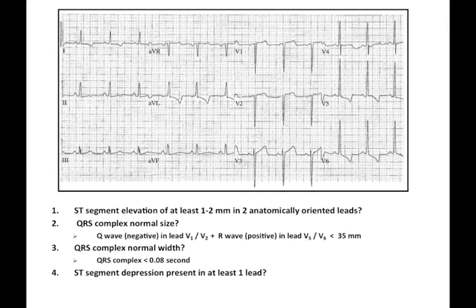The next example, do we have ST elevation in at least 2 leads? The answer to that question is yes. Look at leads V1, V2, and V3. We have elevation in all 3 leads.